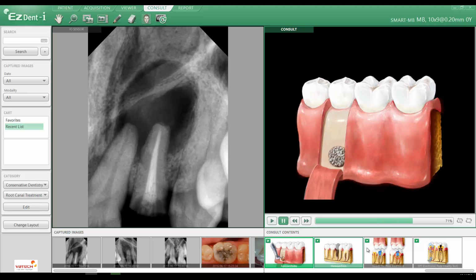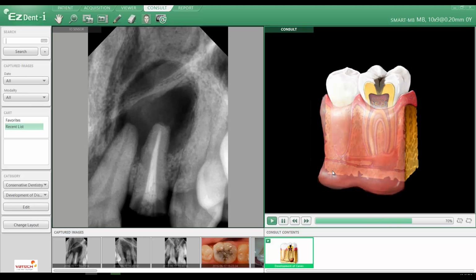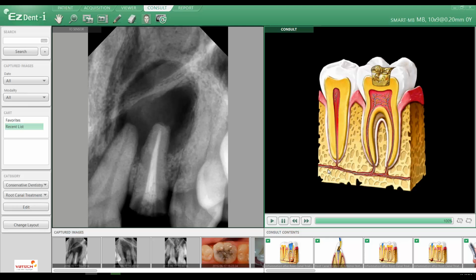You can fast forward to highlight as well, and you can also use a different video here to help explain how a disease in one tooth can spread to another tooth and affect multiple teeth. And then lastly, also show the ability to do perhaps an implant.